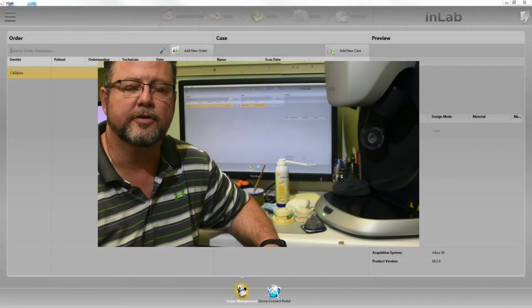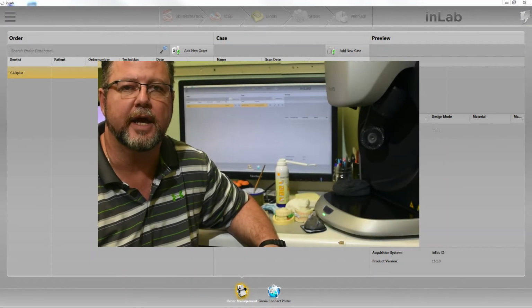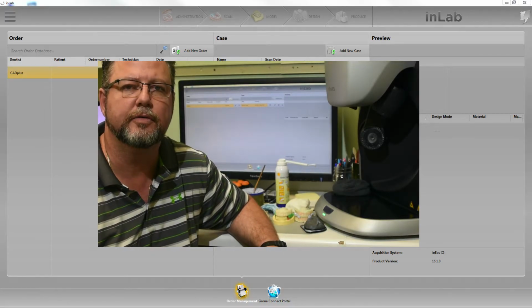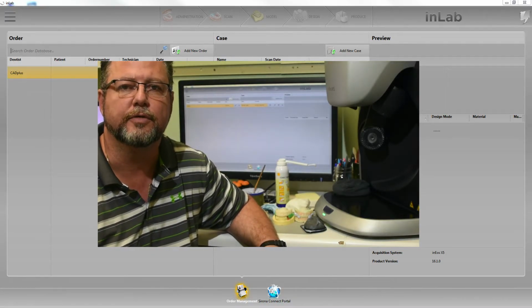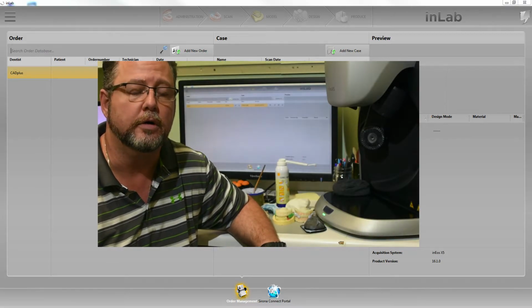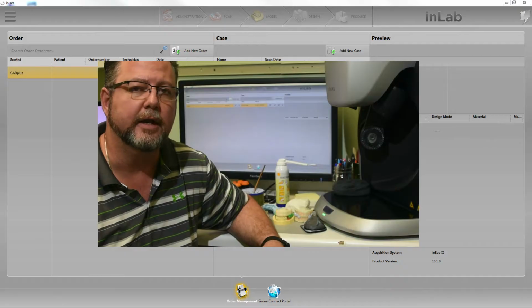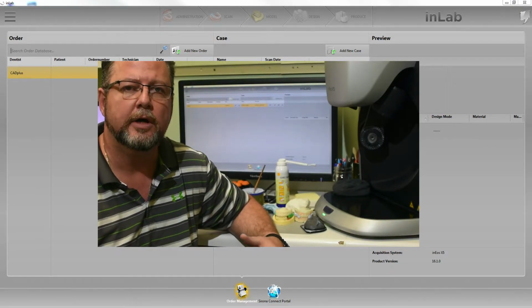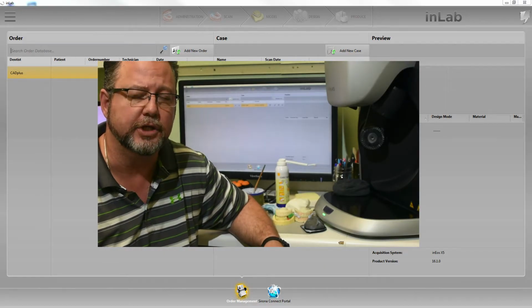Hello, this is Mike Suris from Dental Professional Labs in Maryville, Indiana, coming to you today to talk about scanning impressions and try-ins for dentures to submit to Dentsply Sirona and the AvaDent portal. We're going to go over scanning impressions, scanning the try-ins, and how to convert them to STL format for submission.